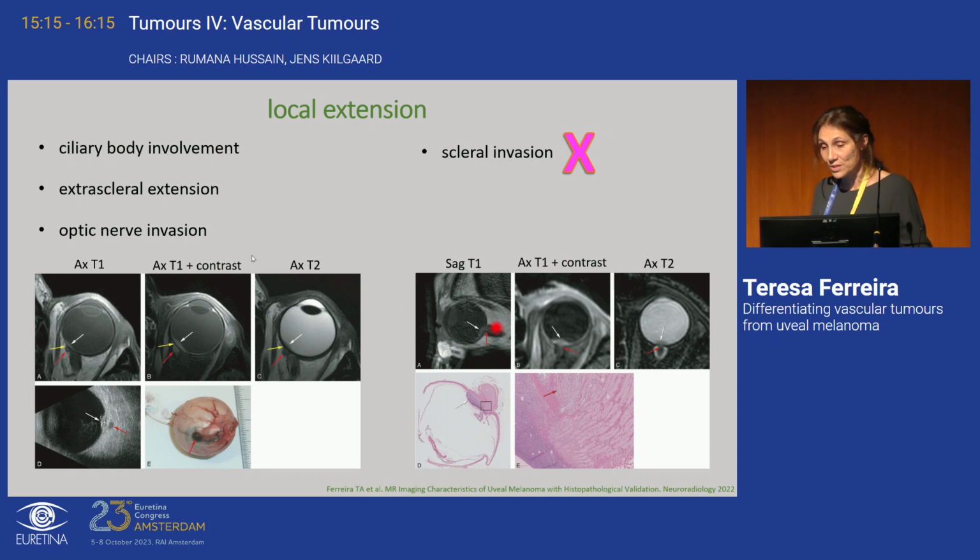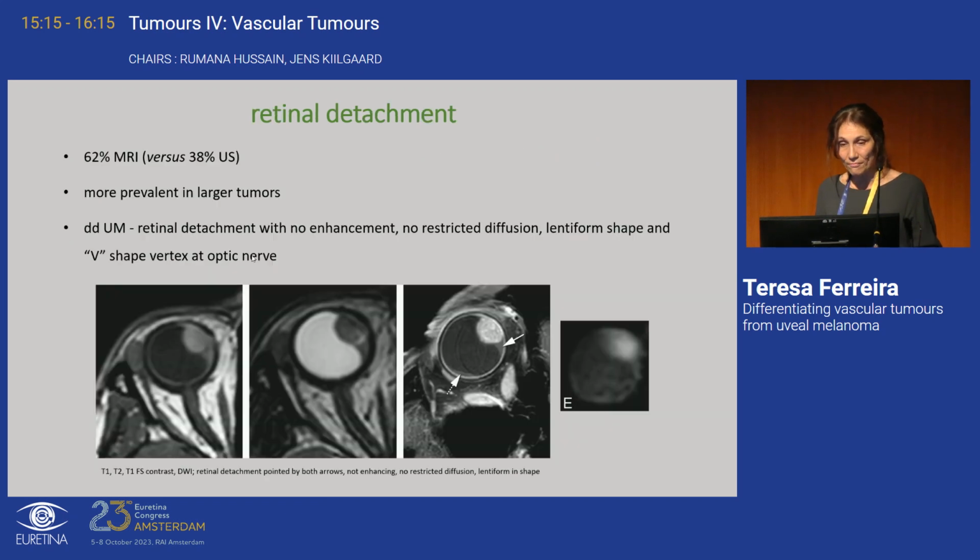This other example is also a very flat intraocular tumor, but on T2, if you look at the red arrow, it's very subtle, but you see signs of postlaminar invasion of the optic nerve, which was proven to be true after enucleation.